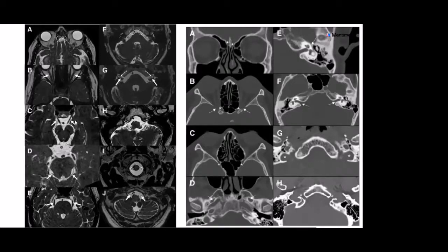The oculomotor nerve, we learned that it runs into the interpeduncular cistern. So remember the interpeduncular cistern, and the structure which is running anterior to it or arising in between the peduncles is the oculomotor nerve. Then for the trochlear nerve, we recall it's the only cranial nerve which arises from the dorsal aspect of the brainstem.